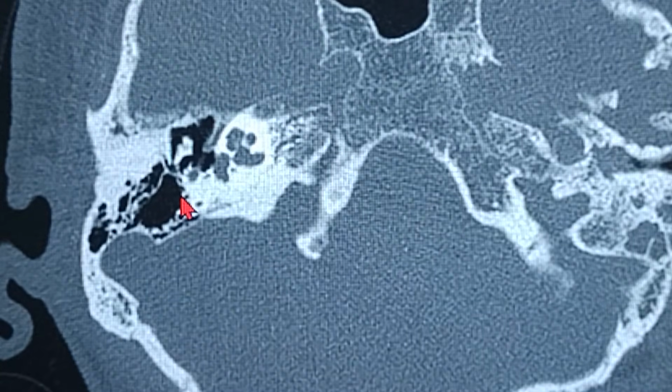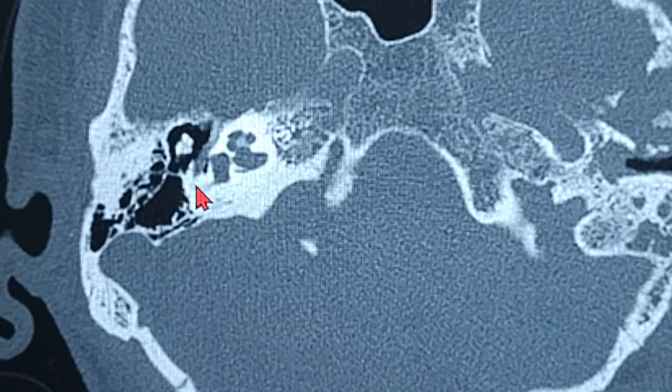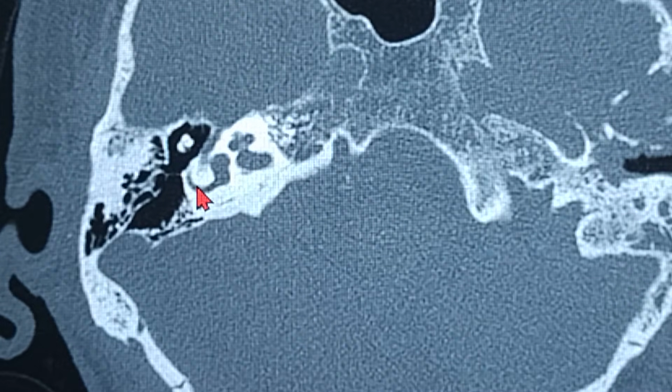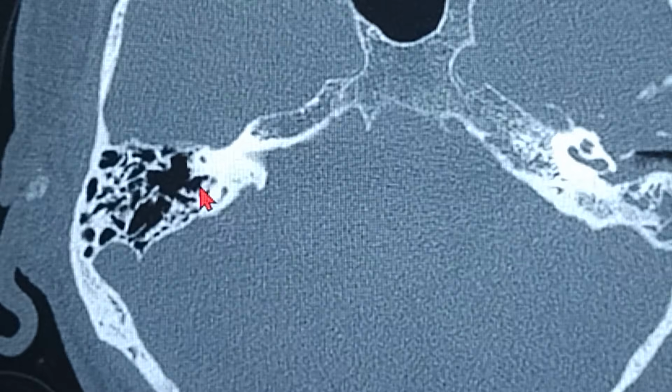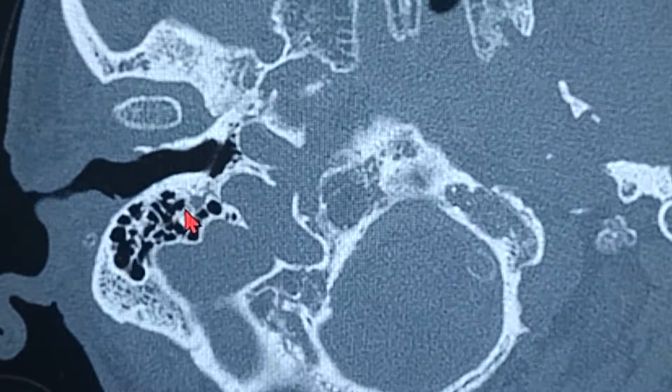The most important thing in cases of accidental trauma or iatrogenic injury is that the facial canal holds a very important place. Now, how do you find the canal? How do you find the facial nerve is a huge issue, right? So I'm going to give you an easy landmark to follow the facial nerve. We saw the scans from below upwards, right? So let me just show you. This was the lowermost area right there.